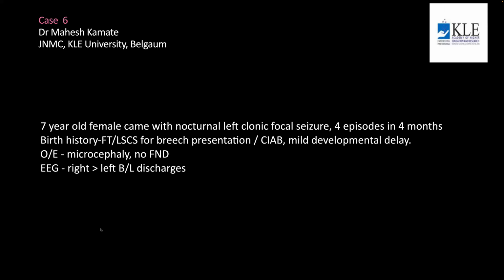We did EEG and MRI as a part of evaluation. EEG is suggestive of right more than left epileptiform discharges. And MRI showed T2 and FLAIR white matter hyperintensity. I'll show the MRI.